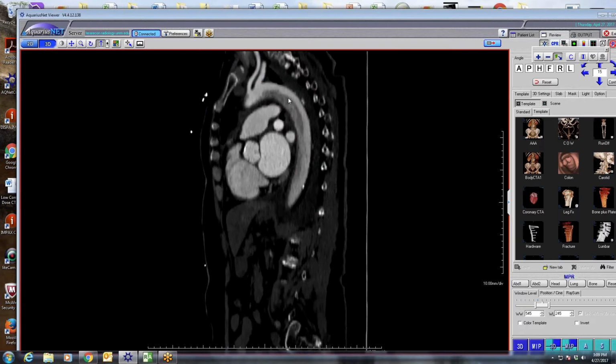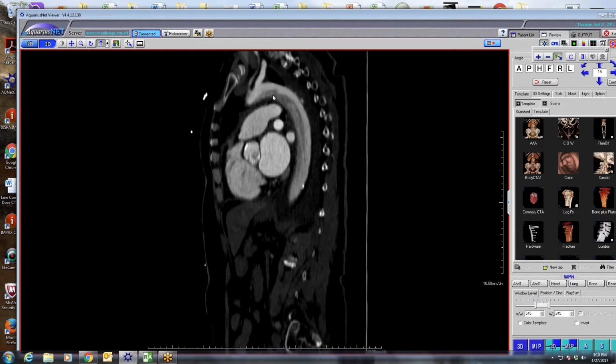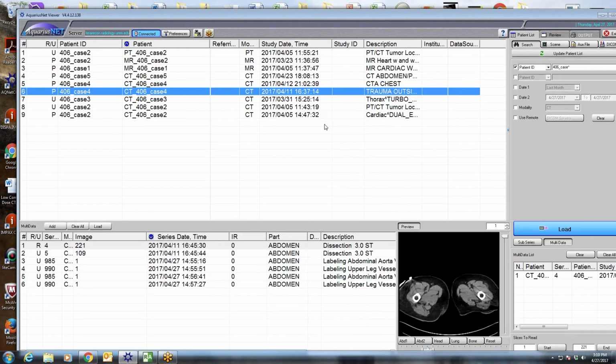But you can see just a slower flow right along there. Yeah. And in fact, I have a thrombus that looks almost exactly like that from when I was in residency. It's the same location. But this big? I'll find it. Wow, that's impressive. I mean, we've seen smaller thrombi, but that's.